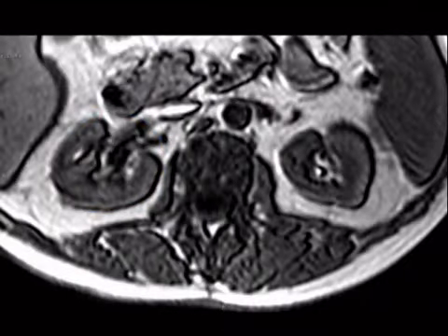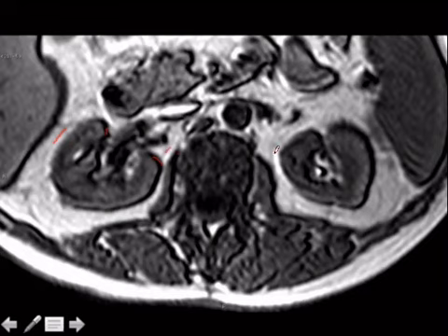So let's go back to this. Let me point out something that's very important here. Notice that we got white here, black, black, white, black, white, black, white, black. It's occurring in this direction. This is the frequency encoding direction. Remember, that's frequency, and this is the phase encoding direction, and this is the one where you get your pulsation artifact. Now, who cares? People who write test questions care, and that's the only thing you need to know.